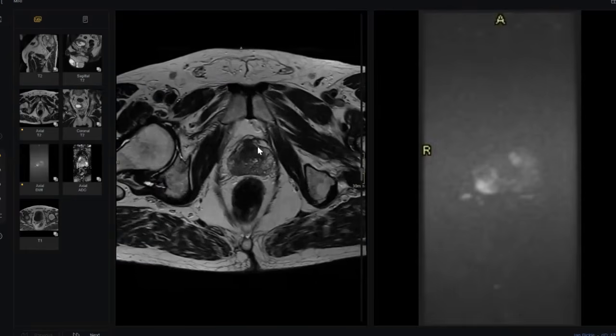Look here, markedly low T2 and very, very well defined. I think this is called erased charcoal sign. I think this one. Okay. At least you can give PI-RADS 4 or 5. And at least 4, and you will see the size.